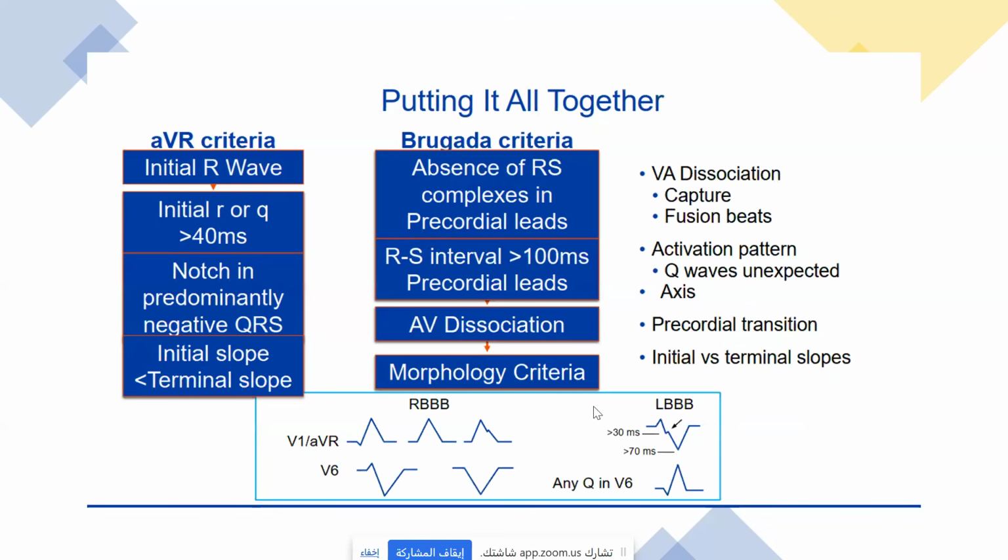But if it is an atypical form of right bundle branch block morphology, as you find one uniform R wave in V1, or you have a fractionated R wave, as you see here, or you will find in the left bundle branch block a stuttering descending limb, and usually this does not happen with typical left bundle branch block.